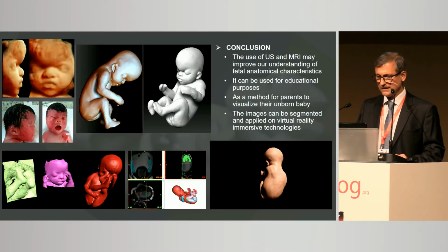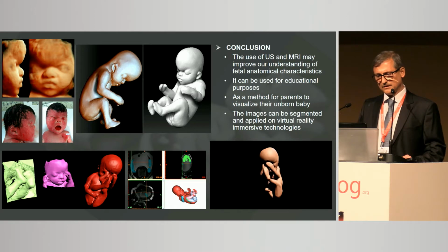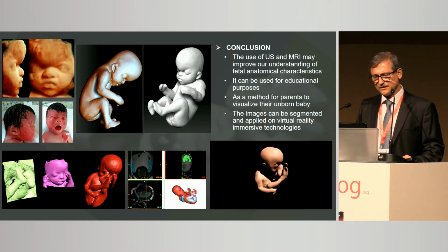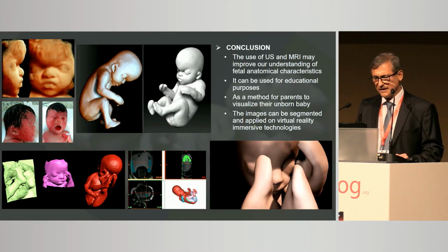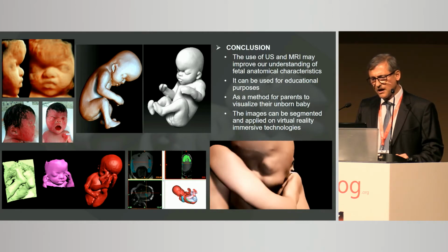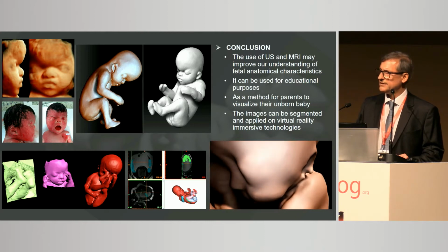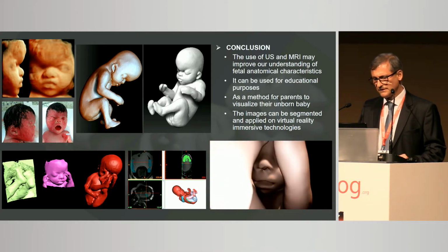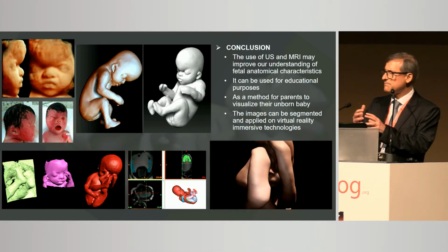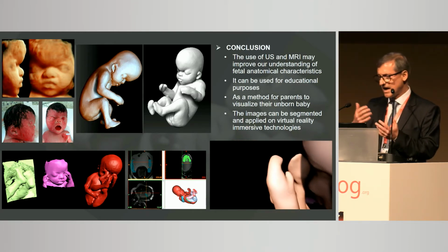So it's another didactic way to see it, but you can see, as I'm doing here, in 360 degrees using the virtual reality device. So here, another example, you see in the ultrasound the fetal face, front and profile. You see how ultrasound seems the postnatal here. We reconstruct also using the MRI information, so both exams are done on the same day, and then you have the segmentations and using parts coming from ultrasound and MRI, you can prepare the device and navigate.